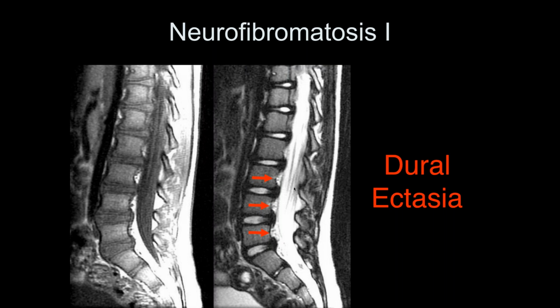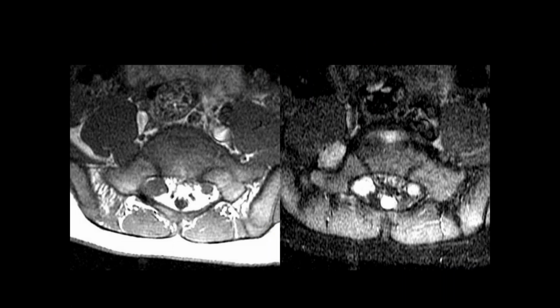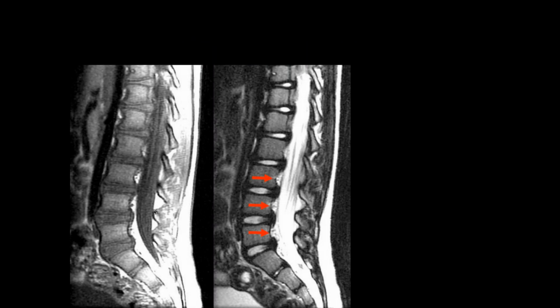In this particular case, it doesn't look like it. That's a very wide canal, isn't it? It's a very wide canal, and this is fat in through here. So I don't know. Let's skip this case. That doesn't make any sense. But I think this is in this. I think no, this is a different patient.